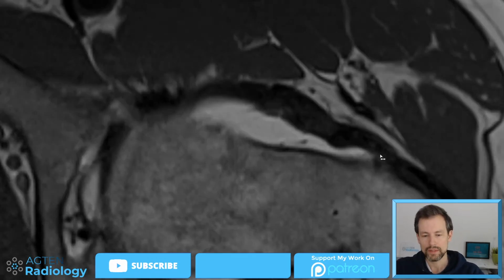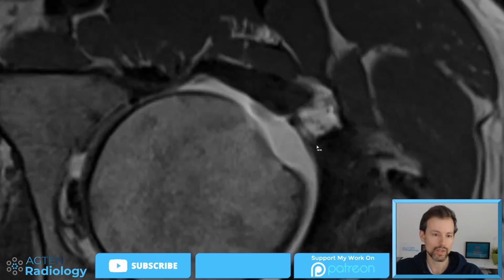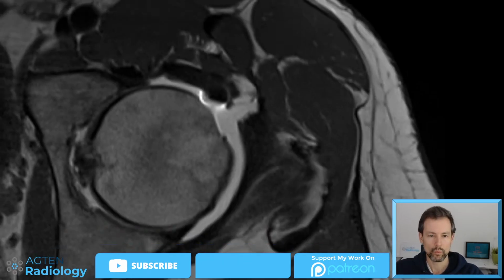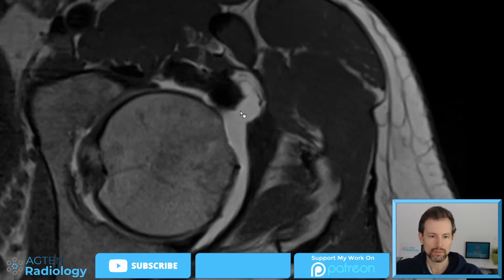The joint capsule on the lateral portion, it's not adherent here to the shaft. It's not medialized in a sense, so I think that's quite okay. And we don't see a bridge, this sail-shaped adhesion that we had in the first case. So, not too bad. But, as opposed to the previous case, we now have a large defect in the joint capsule here.